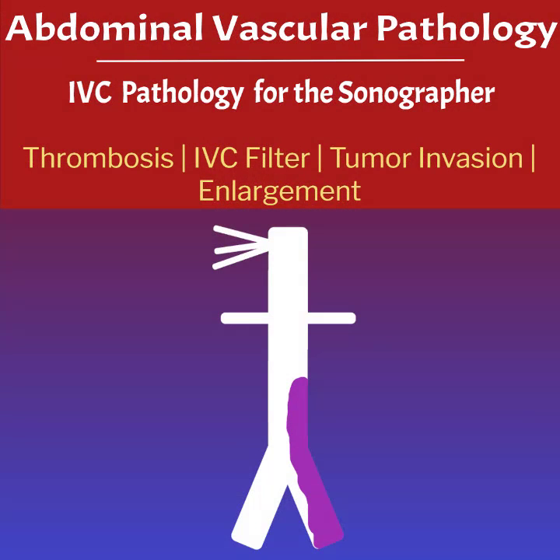Welcome to our sonography lecture on abdominal vascular pathology, part 2 of 5. This lecture is going to focus on inferior vena cava pathology, looking at thrombosis, IVC filters, tumor invasion, and enlargement.